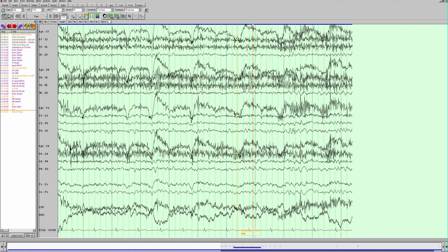A lot of people in their reports for this will just say, this is an abnormal finding that is nonspecific and consistent with diffuse neuronal dysfunction. It's very generic, but it does explain that this finding can be secondary to a whole host of different etiologies. And it's always important, as usual, to mention that no epileptiform abnormalities were seen during this recording.